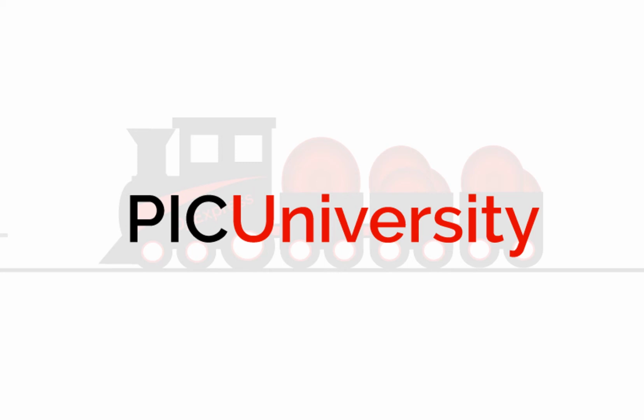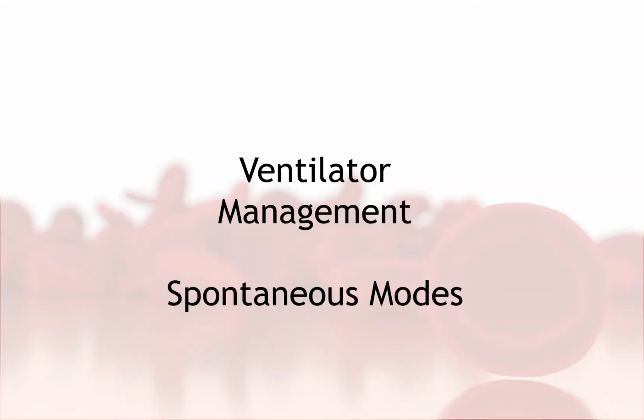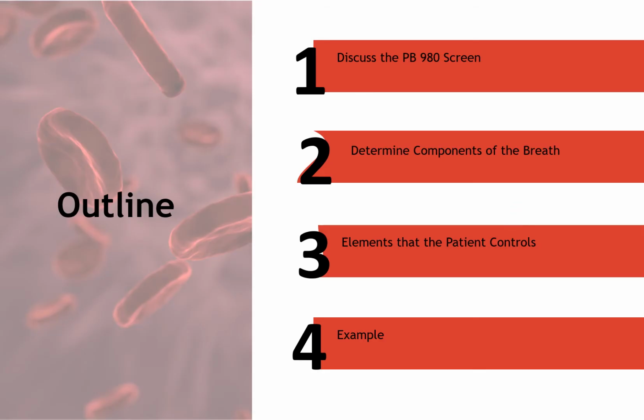Thank you for joining us for our ongoing lecture series on ventilator management. Today we will be discussing the various spontaneous modes of ventilation. We'll start off with the Puritan Bennett 980, going over the screen outline. It just happens to be the ventilator that we use in our institution. However, if there is a desire to have other ventilators discussed, including the Servo-I or Avea, you can reach out to us and we'll happily provide those.